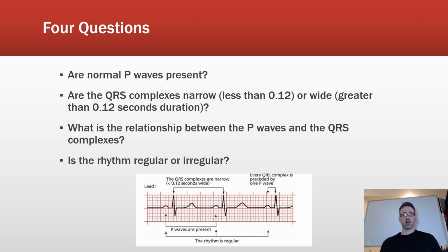And you'll notice that it looks very regular. The rhythm looks very regular. So this is normal rhythm.